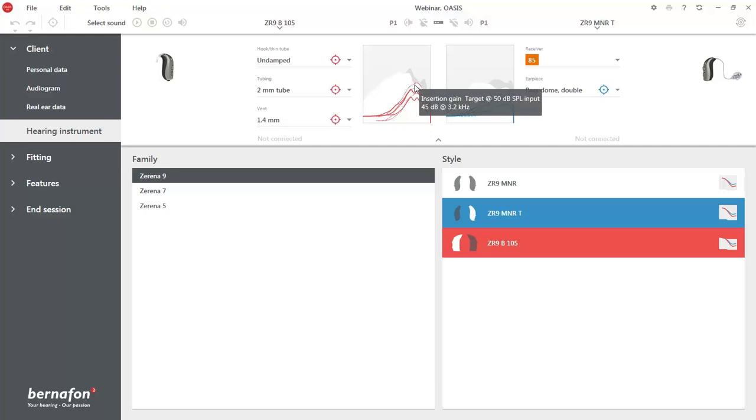And in the next module, when we're talking about fittings, we'll be discussing adaptation. What this is showing me is that at the moment, the adaptation manager isn't on 100% because I haven't changed the gain at all, I know that, and they're not reaching the targets. So therefore, it's not on 100% as yet.